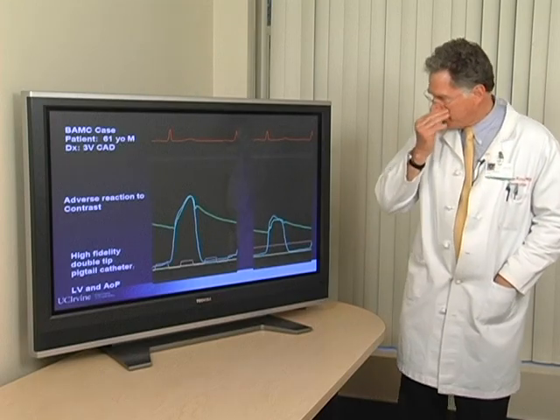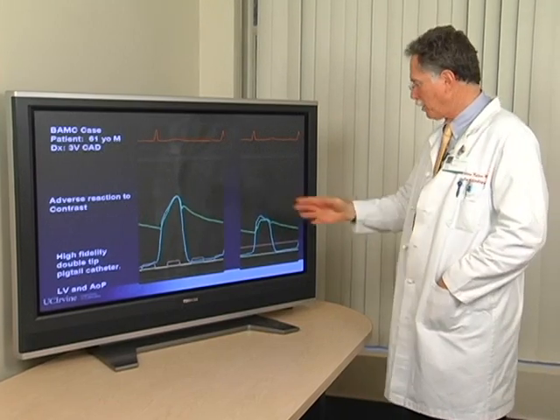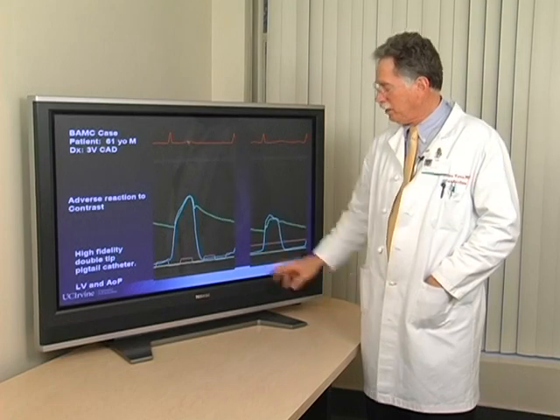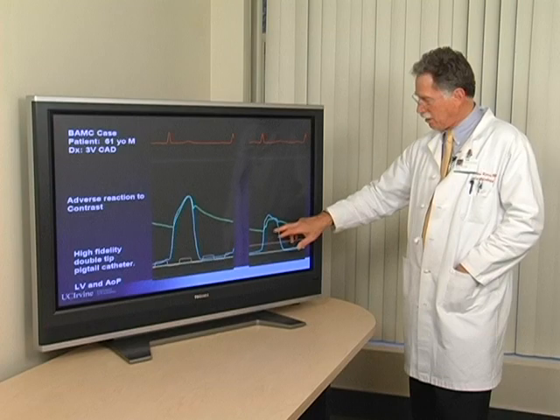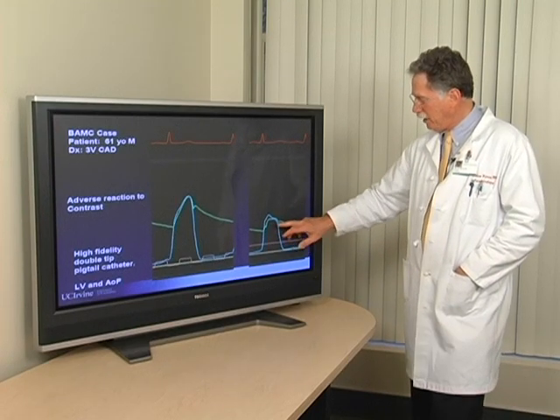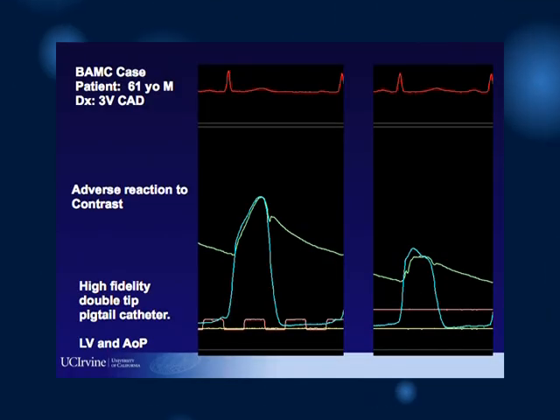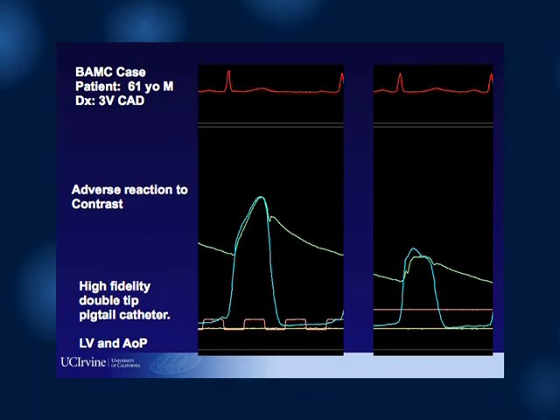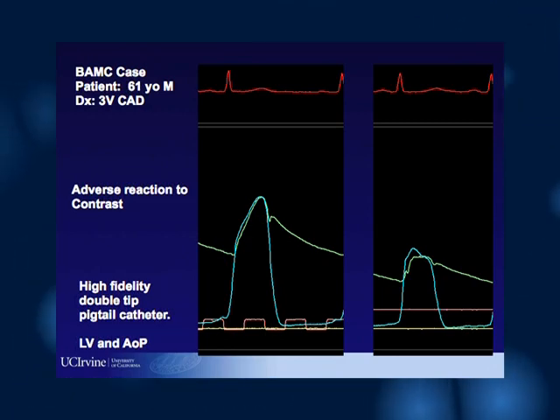Now, in the cath lab, we use these pressures to tell us about problems that may develop. Here's a quick example of a patient before left ventriculography who had normal aortic pressure and normal left ventricular pressure, and then suddenly after ventriculography had hypotension. And we believe this hypotension is due to an adverse reaction to contrast because we see very low filling pressures, eliminating the possibility that this was tamponade, perforation, myocardial ischemia, or valve rupture. So this is a manifestation of vasodilatation due to contrast allergy.